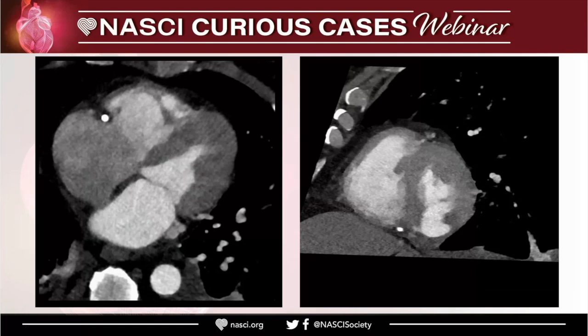I said the true aneurysm. So do you think this aneurysm is related to the acute infarct? See how it is bulging and involving the inferior wall. So this is probably because of the rupture of the infarct. This location is common for rupture, and you see how the neck is and how it is bulging out. So this is probably a pseudoaneurysm related to the infarct. Probably it ruptured and caused the aneurysm.